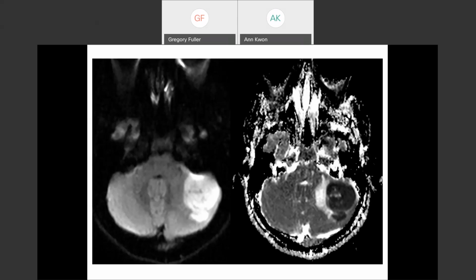All right, what are the sequences? Anybody want to text those in? What sequences are we looking at? What is the left? What is the right? All right, Sanjay Singh, expert neuroradiologist, says this is a desmoplastic medulloblastoma. Dr. Singh is correct. I'm looking for one more thing. Actually, what is more important than desmoplastic? There's something that's more important because it's more specific. It will guide the clinicians to a greater degree.